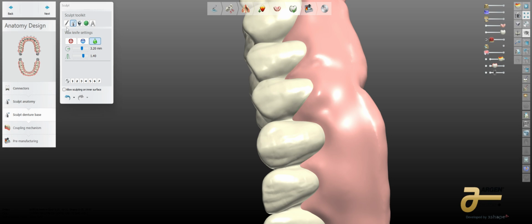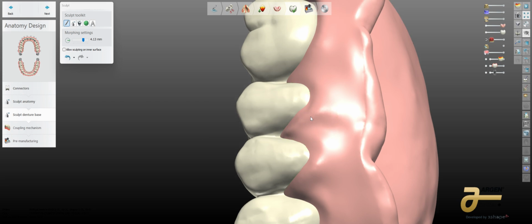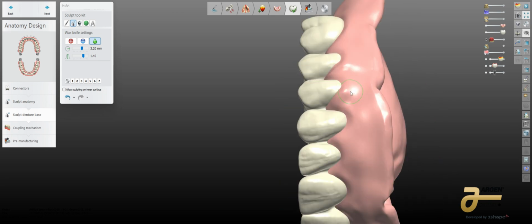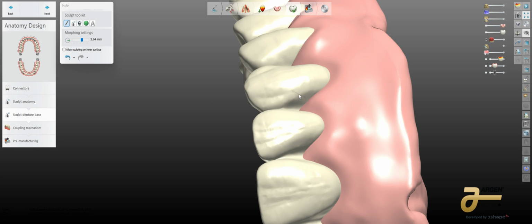We know where natural papilla goes. And when you see papilla way up here, what does that tell you? Well, that tells you, one, that either the library wasn't designed right, or the tech doesn't understand what's going on there. So guys, make the papilla not tall. Boost it out in the areas that you're going to have this natural look to it. Smooth out the rest. Don't do too much. I mean, literally, you can get away with utilizing the features of the software to make a pretty decent proposal.